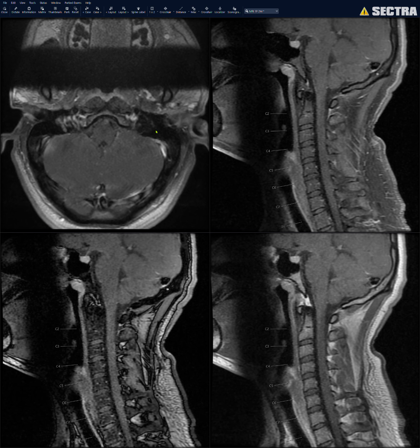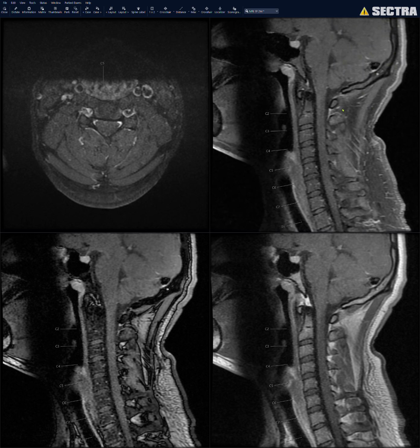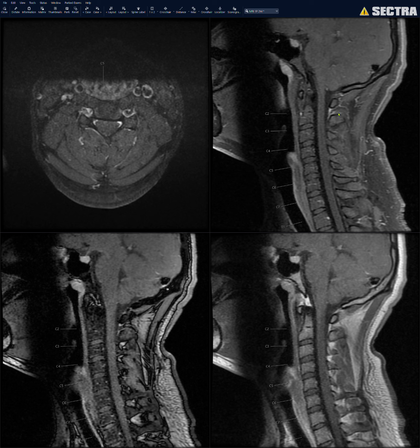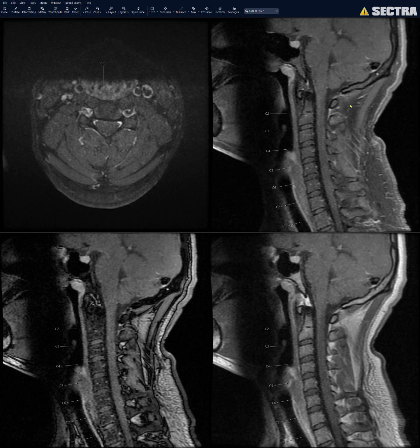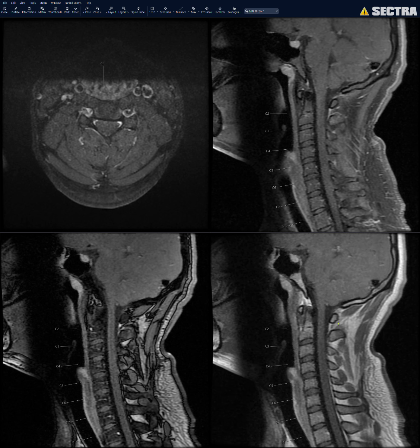Now, next couple of sequences. So here are the post-contrast sequences. This is the T1 fat sat axial post-contrast. This over here is the sagittal T1 fat sat or T1 post-contrast. Now, the way that we do fat saturation for the sagittals is that we get post-contrast images out of phase, which you see here, all this India ink artifact, and we get post-contrast images in phase, which is what we see here. And we use these two images to create our fat saturation post-contrast images here.